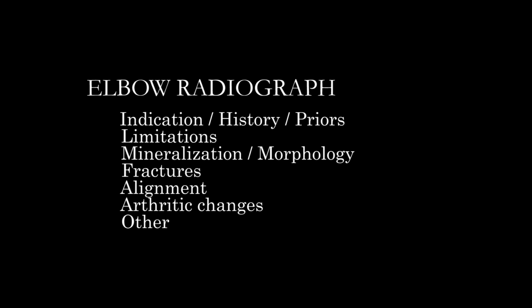So, just as a recap, in terms of approaching the elbow radiograph, it's good to start, as always, with an understanding of the patient, prior studies, what the indication for this particular study is, look at the overall limitations, technique, understanding the overall morphology, mineralization of the bone, looking carefully for fractures, issues with alignment, looking for arthritic changes, and then finally osseous lesions, and then the soft tissues.